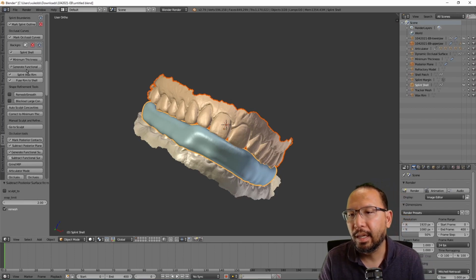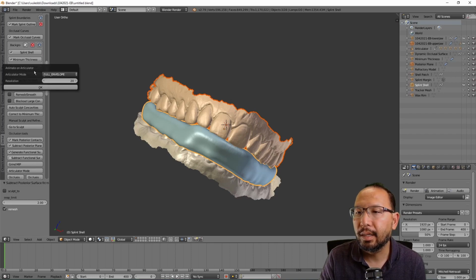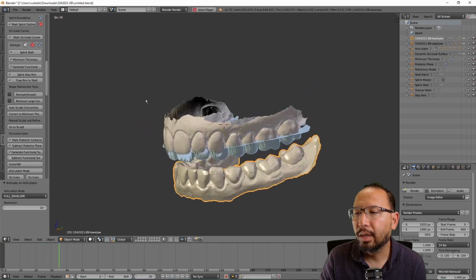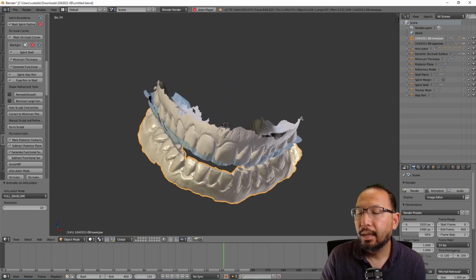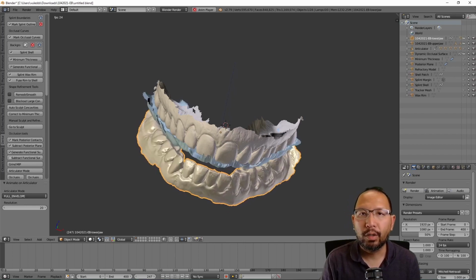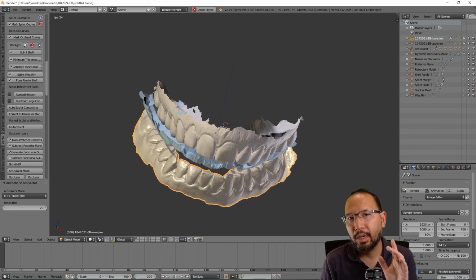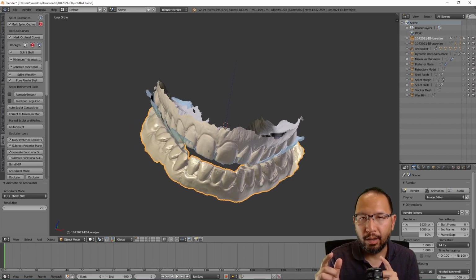since you've probably never seen that before, I'll show you what that actually does. You can see here it was already done in the background while we were doing the other steps. We're going to go ahead and click it here, and you'll see what that actually looks like. It is actually running a simulation of all the possible excursive and protrusive movements using that virtual articulator you saw way back up in the early workflow. Remember all those condylar settings and all those things that we ignored? Well, it's actually using those now to literally run through the motions.